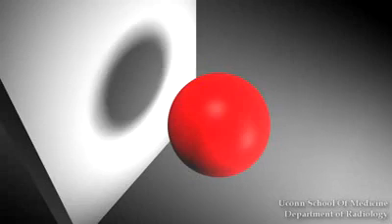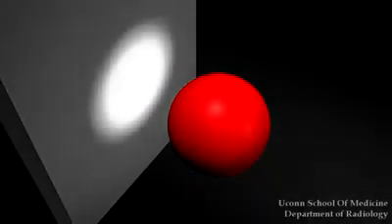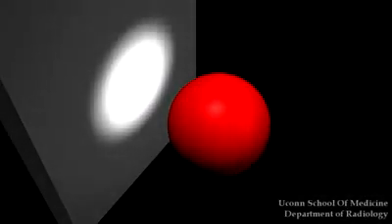X-rays are a form of high-energy radiation produced somewhat analogous to the beam radiating from this flashlight. The object sitting between the source and the image receptor casts a shadow, which is then recorded by the image receptor, represented by the white wall. This is what produces the image that is viewed as a radiograph. When thinking about radiographs, it's helpful to imagine that the receptor starts out all white, but when struck with an X-ray, turns black. If a dense object like this metal ball blocks the X-ray, it leaves a white impression within its shadow.